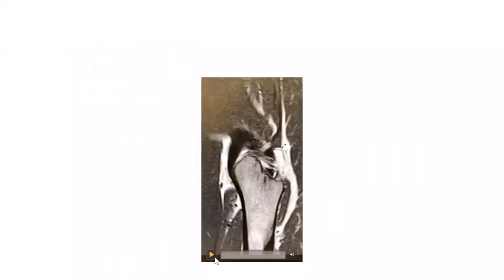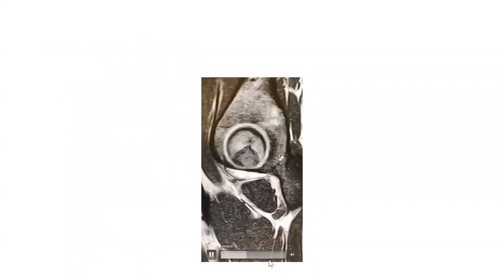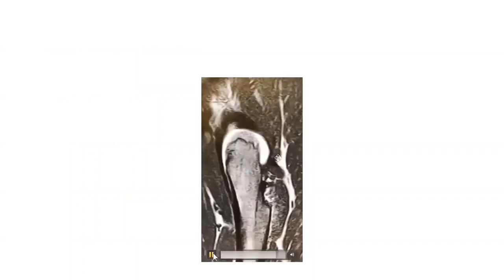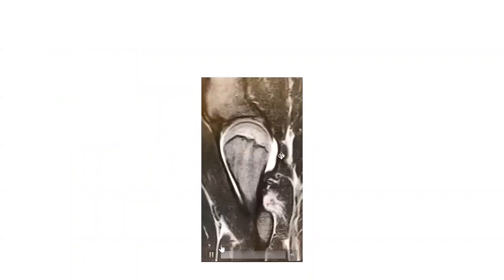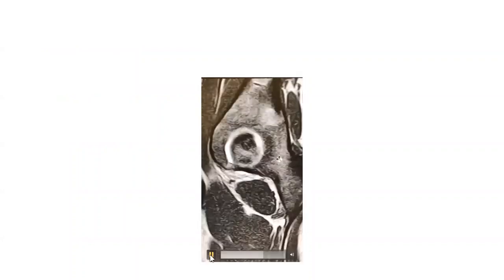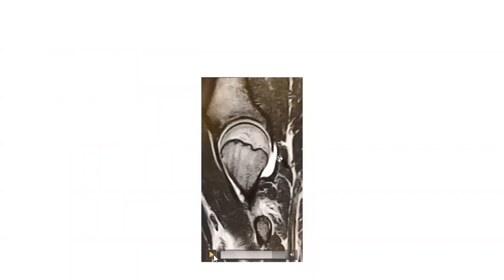So this is the same hip, looking at it in an MRI, okay? And what this shows me, I'm gonna loop this a couple times so you guys can see it again, is now I can really see the fluid around the joint. You see the white halo around the hip? So that's telling me there's extra fluid in the joint. And I'm gonna do a pause here. These are some tendons crossing in front of the joint. And this is the muscles around the joint. So it gives me a totally different perspective, okay?